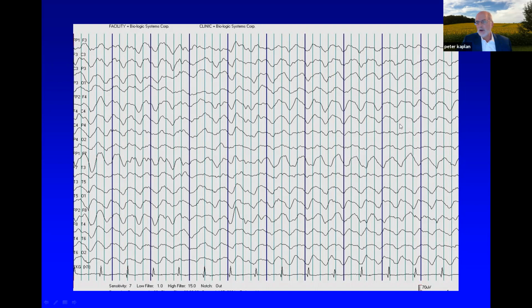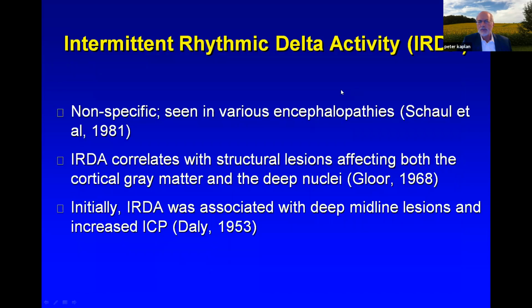That was a patient who had limbic encephalitis and was in fact in limbic status, and it broke with a benzodiazepine. But this, to all intents and purposes, looks like an encephalopathy. It does not look like seizure activity.